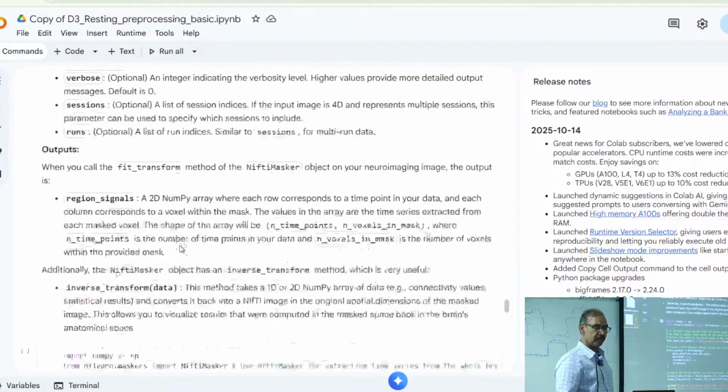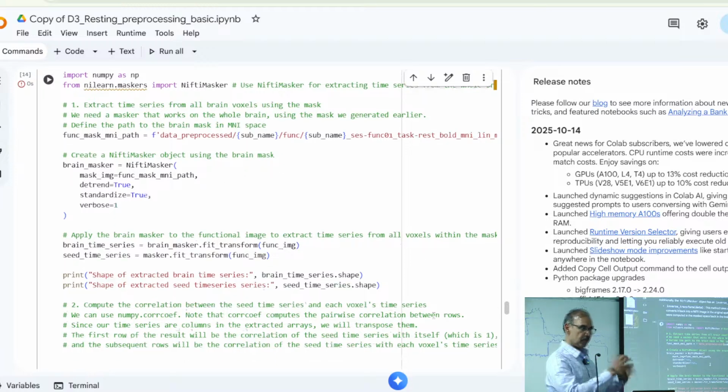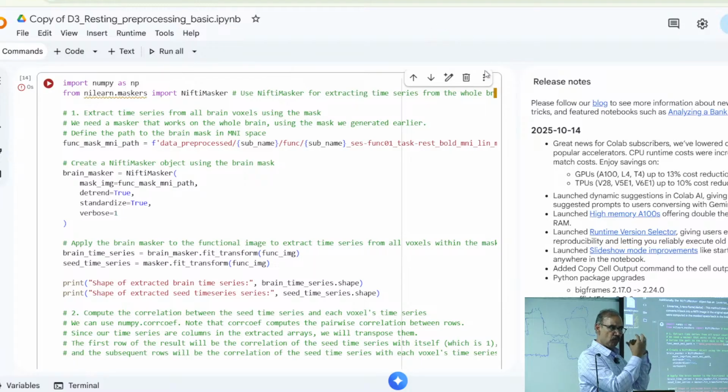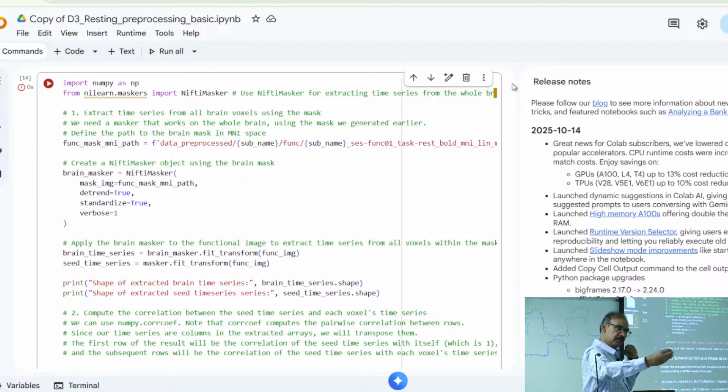And then we extract the time series for that region, right? So first, on the MNI template from XYZ, we know which region is what, and for this one, the coordinate was minus 38, minus 22, 60, right? So that's the location. Now I want to display the time series, right? So now I simply go to my functional resting state data and generate the time series, right?